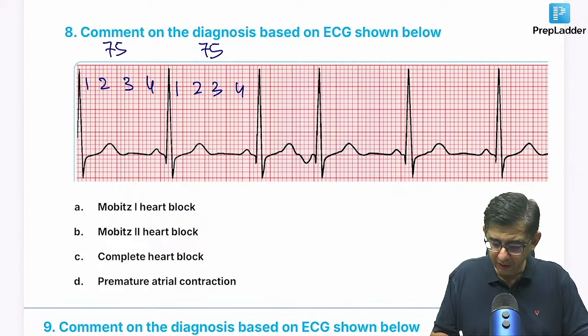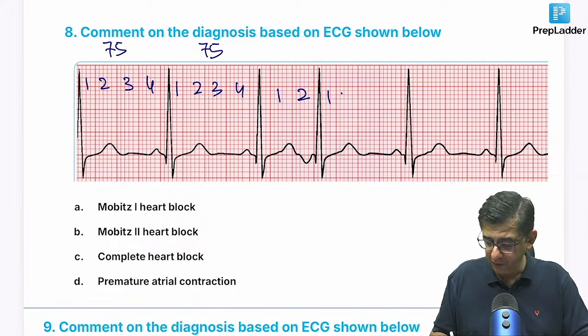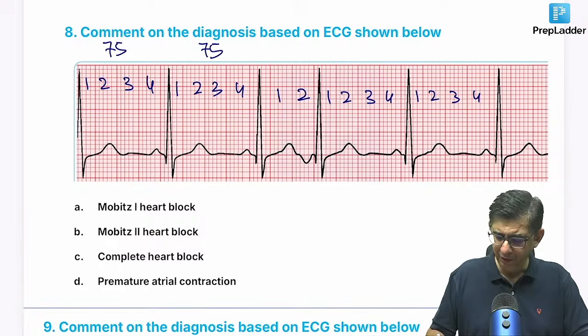Then is the heart rate jumping up? So I'm at 2.5. If I say 2.5, suddenly there's a jump in the heart rate of the patient. Everywhere else here, the heart rate is only 75, which is perfectly normal.